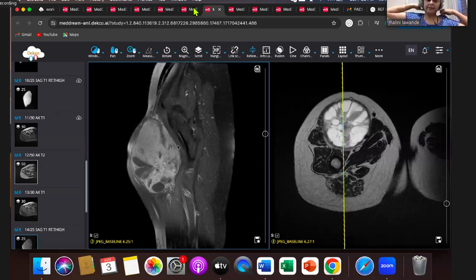And it's perfectly fine labeling it as soft tissue sarcoma and not going into the subsection. Calling this a malignant lesion, a soft tissue sarcoma would be fine. Further, whether it's a spindle cell lesion, a synovial sarcoma, some myxoid liposarcoma, or a more dedifferentiated kind of liposarcoma, there are a lot of different types of soft tissue sarcoma where you may not be able to make out the differentiation, and that is fine.